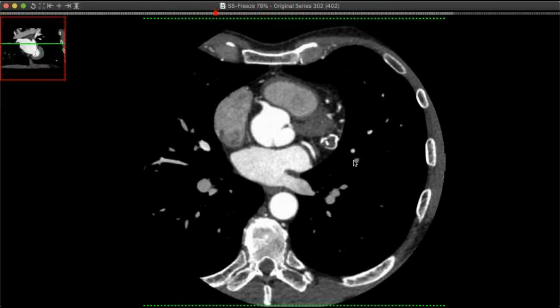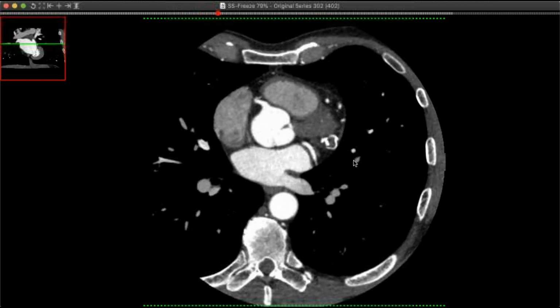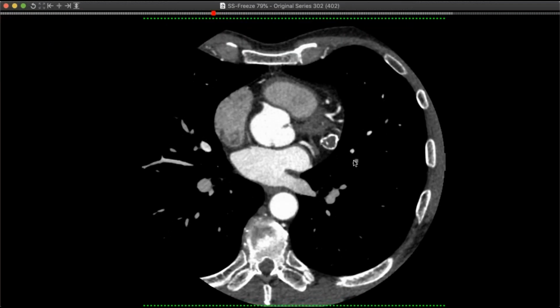But so the question is, what kind of coronary? First of all, I don't know what they're going to do with this. That's a question probably for the cardiologist. Do you do a cath? Do you put a stent across it to prevent it from doing anything? It looks pretty thrombosed at this point. I was wondering, is this old Kawasaki's disease that just was never diagnosed?